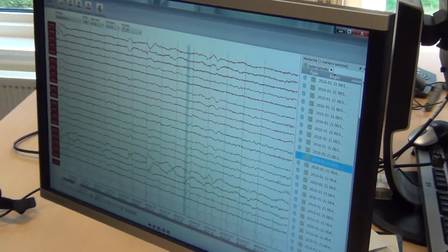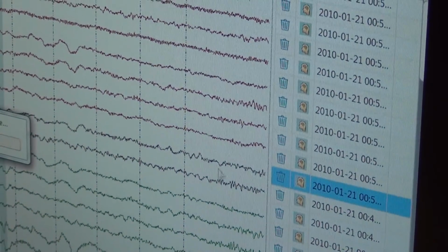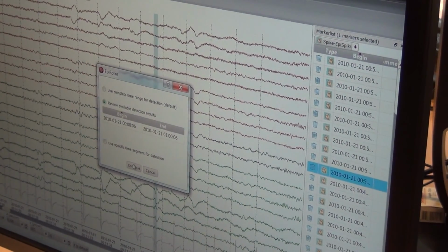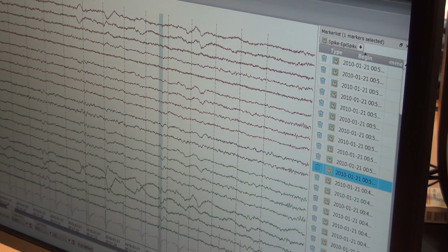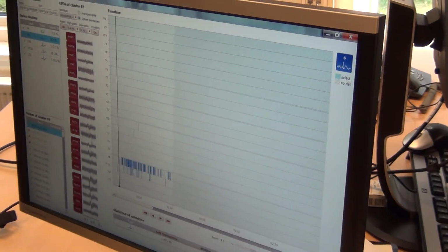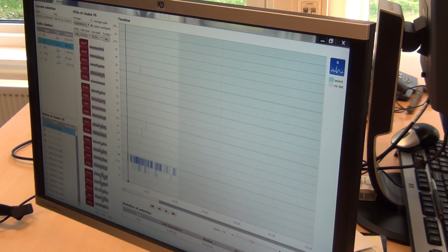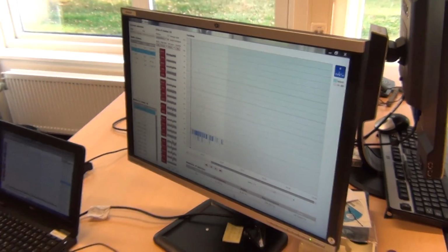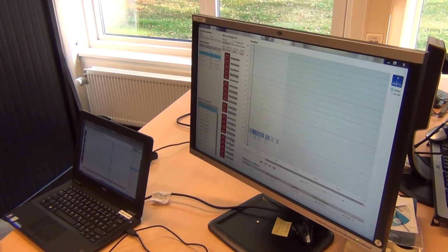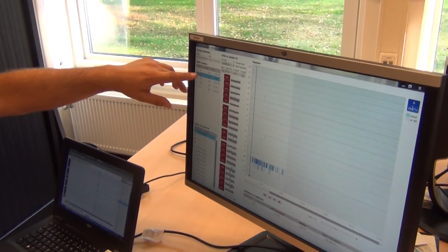Since the last review, we further developed this, and on top of that we put in spike clustering. I open another window. If I push this button here, epi spike, then this GUI pops up, and maybe I can put the raw data on the other screen. And what you can see here is the result of a clustering approach. We built a cluster based on spatial localization of the epileptic spikes in the 3D coordinates of the MR. And we assigned the labels of the nearest electrode to a cluster.